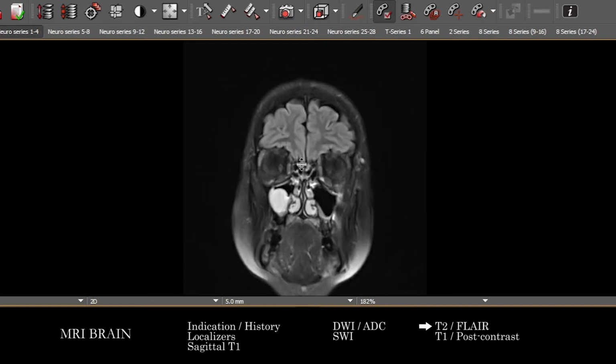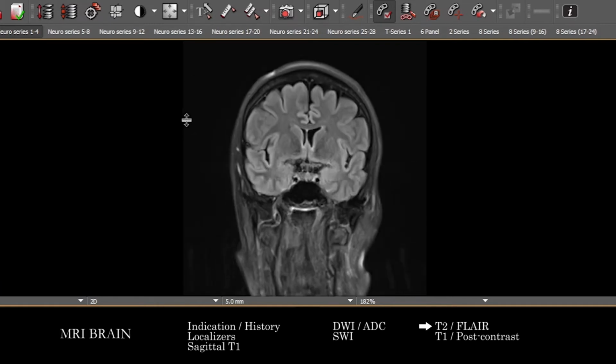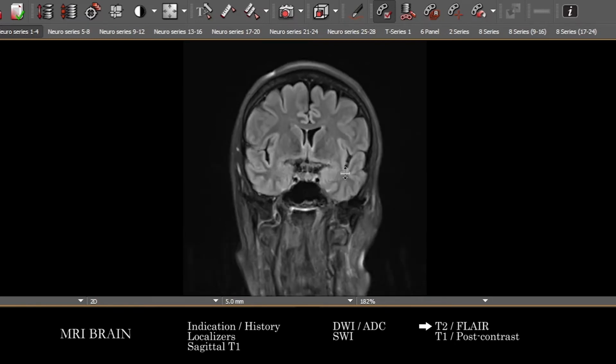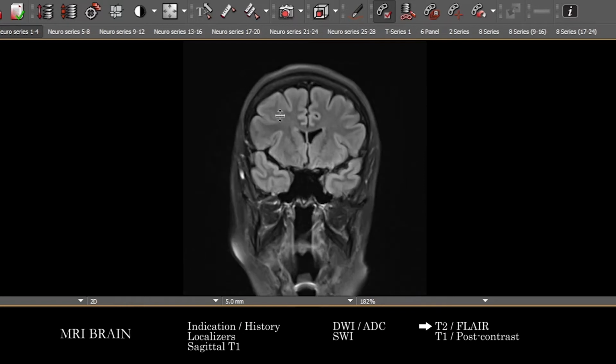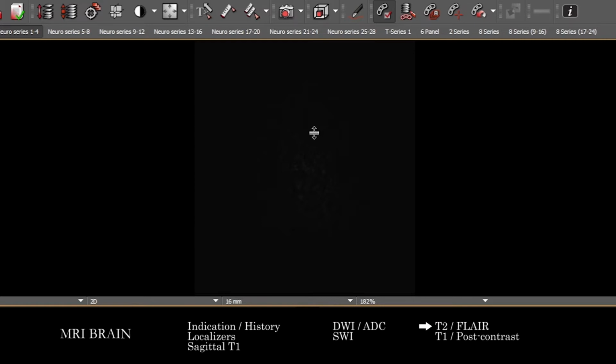This can also be very helpful as troubleshooting to sort out any sort of abnormalities you saw in the axial FLAIR that are not well characterized, or where you cannot see the full extent of its anatomic distribution. And again, major blind spots are typically this upper neck, extracranial soft tissues, and CSF space. People generally will not forget to look at the brain or not forget to characterize lesions in the brain, but you have to remember to look at all the other structures as well.